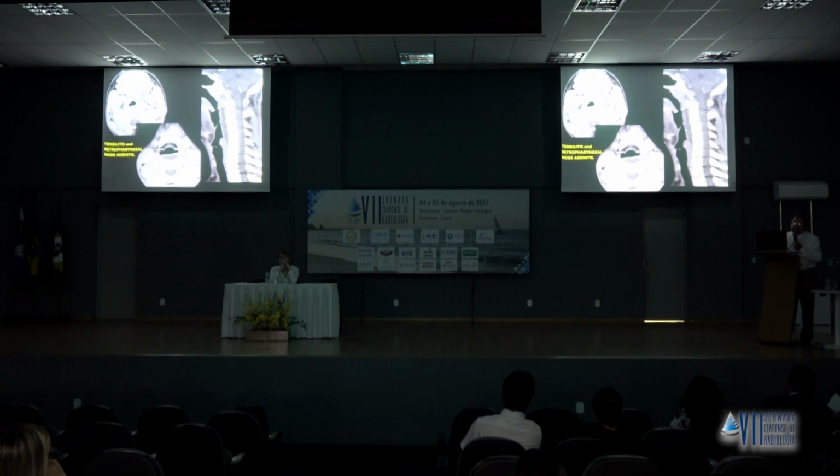And this is the normal right carotid artery. On the other side, a very, very narrow internal carotid artery. When you see that, the reason for that is vasospasm.